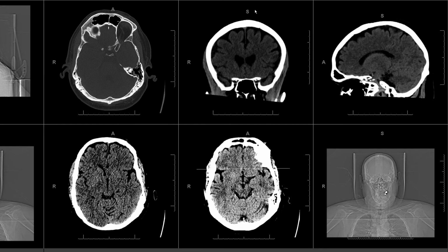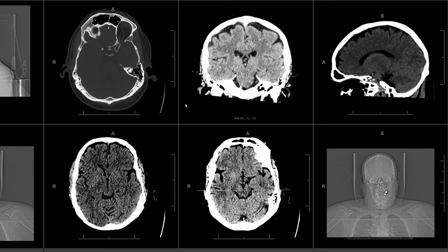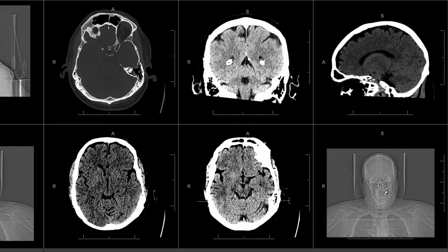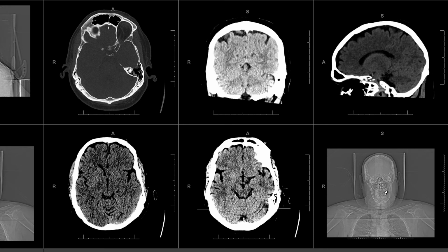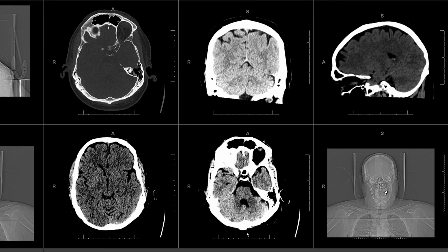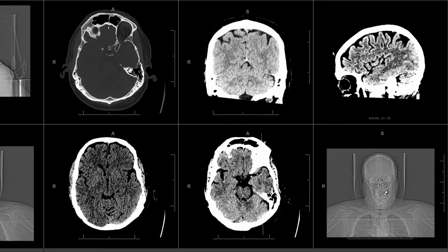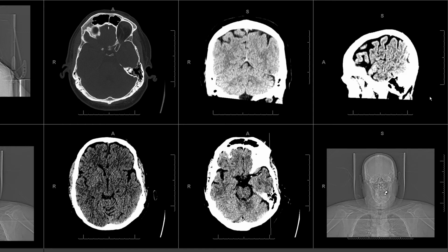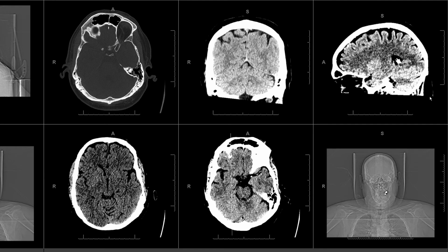Cerebellum. Cerebellum can be helpful to review gray-white differentiation in the coronal projection, as small infarcts can be obscured on the axial projection. Again, we look at the gray-white differentiation on every reformat.